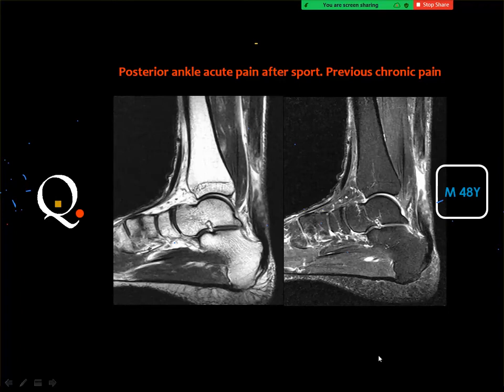In cases of torn Achilles tendon, you measure the gap between the cut edges of the tendon and you measure the distance from the torn edge to the insertion site in the calcaneus. And in the previous days, we used also to mention what is in the gap.